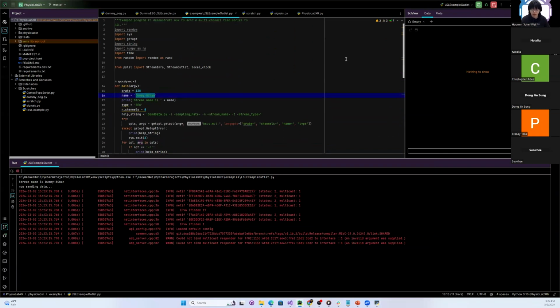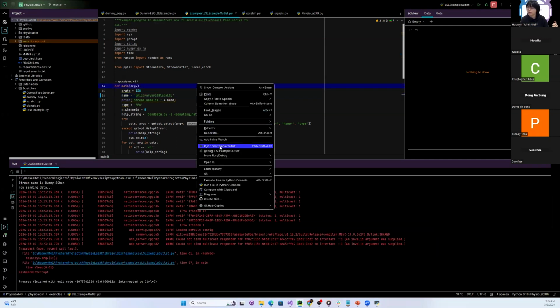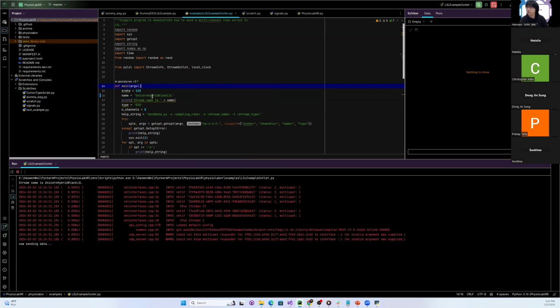Maybe let's do another example. For example, I have a stream called Unicorn Hybrid Black. Imagine that's the EEG signal from the Unicorn Hybrid Black headset. This is a headset you will use during the actual hackathon. So let's stop it and maybe restart it.